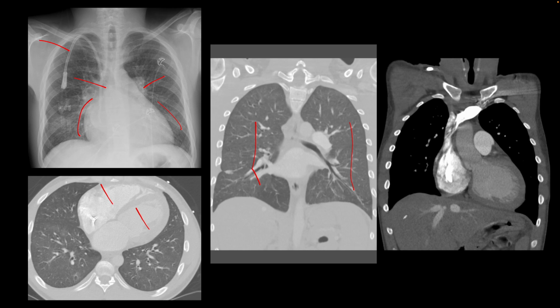So when patients with end-stage renal disease are on dialysis and they miss their dialysis, they develop pulmonary edema, and they may have CHF-like symptoms that brings them to the ER, and a CTPE study may be performed, and you may find that there is no evidence of PE, but findings suggestive of pulmonary edema.